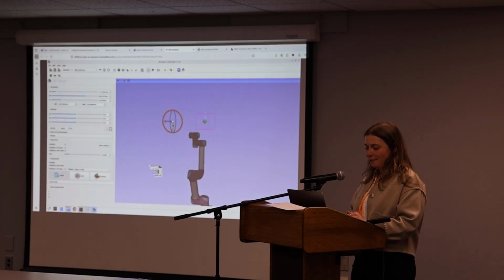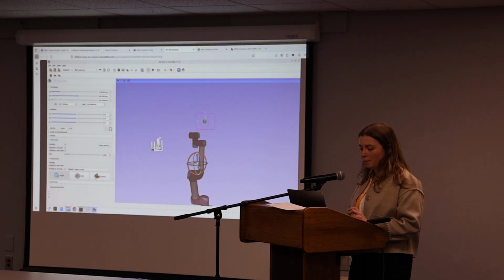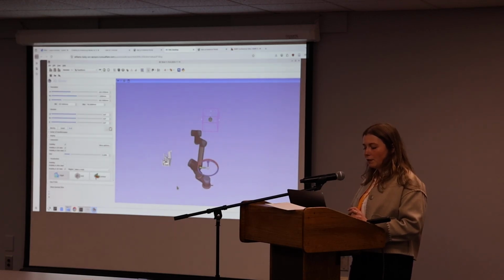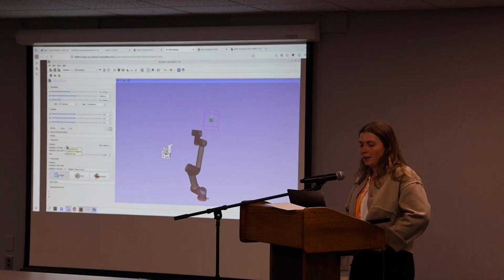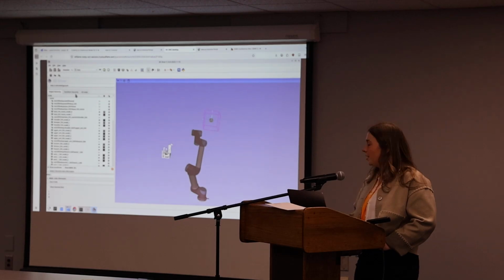So you can move it roughly in front of the robot. You want to just be in the reachable workspace, and then you can rotate it into a more useful position. So it's a little bit of playing around, but I'm going to move it like this. And then you should have your spine in front of your robot. You might need to move it a little bit closer. But this is something you would typically establish with an actual registration of the robot to the patient. So we'll find out if this is visible later, and you can kill this visibility once you're done moving that around.